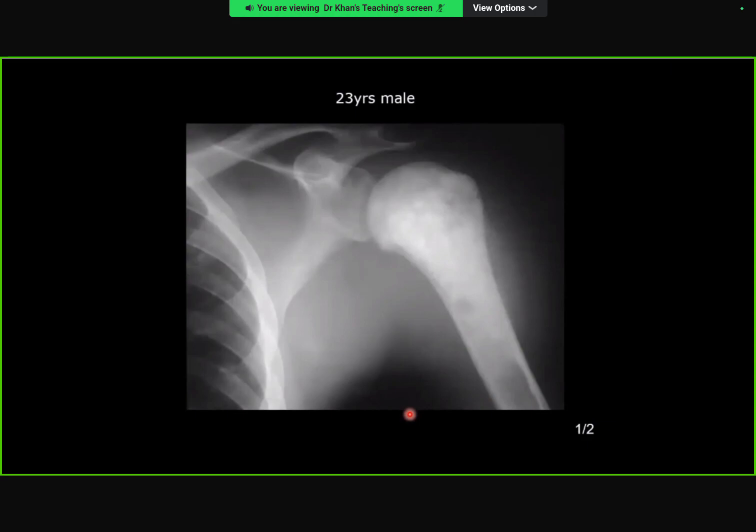So the lesion is centered in the left proximal humerus. It has dense, irregular osseous calcification within, consistent with an osseous matrix. There's an appreciable soft tissue component to the lateral aspect, and in the same region there's periosteal reaction. And again, a wide zone of transition.